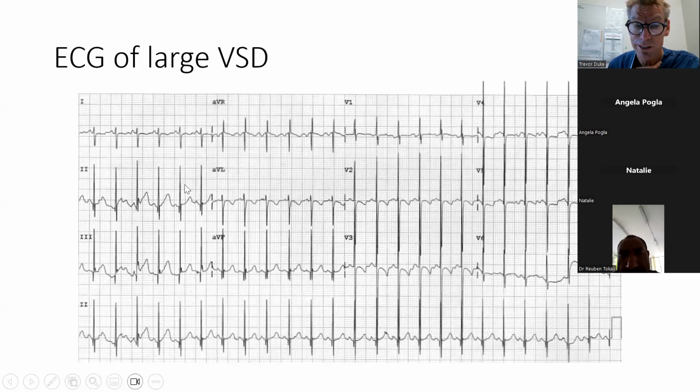The next thing we said was the PR interval, which we've looked at. This is 0.12 seconds. Then we said we'd look at the QRS duration. You can usually eyeball these fairly well, and the QRS duration looks less than 2 small squares, doesn't it? It's quite a narrow QRS complex.